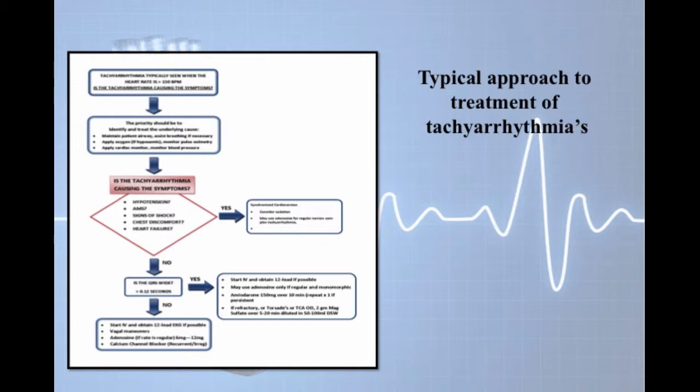Now we travel to the "no, the tachycardia is not causing symptoms" area. This represents a fairly stable patient. You must first identify the QRS complex, either narrow or wide. One easy place to get this information, other than counting the boxes, is using the information box on the top of the 12 lead.